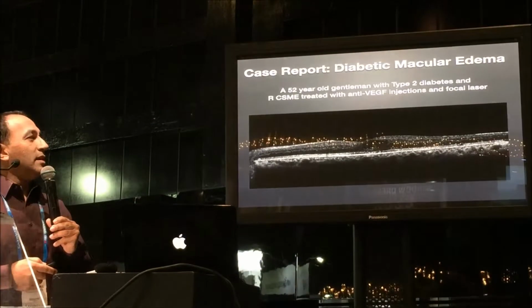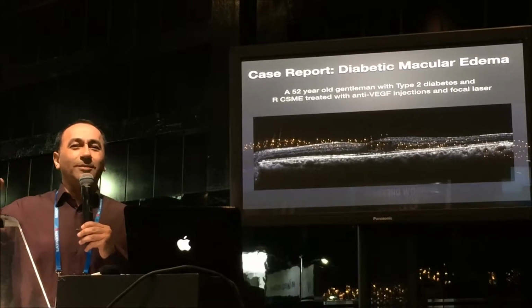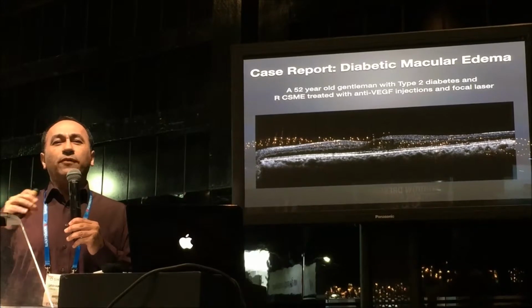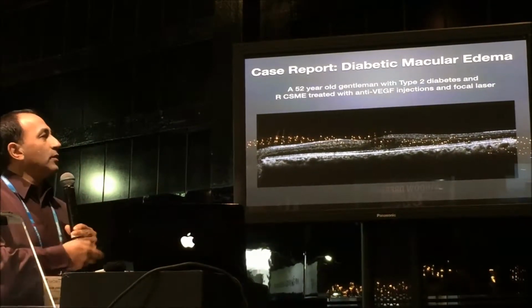And that sort of makes sense because these are not true cysts, they're not encapsulated with epithelium, they're actually cystoid, so they're spaces that have fluid in them. I assume the fluid's going around the capillaries rather than pushing the capillaries away.